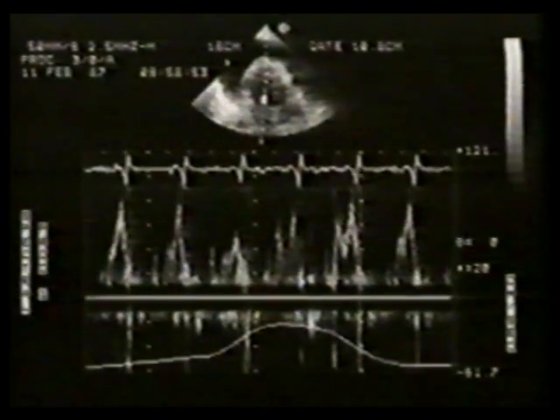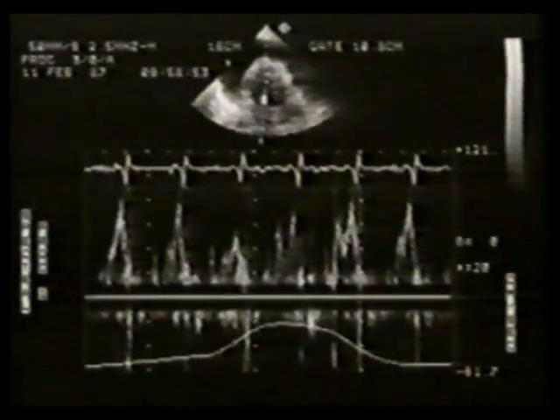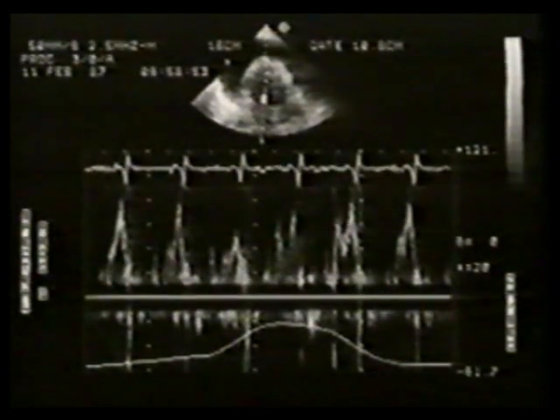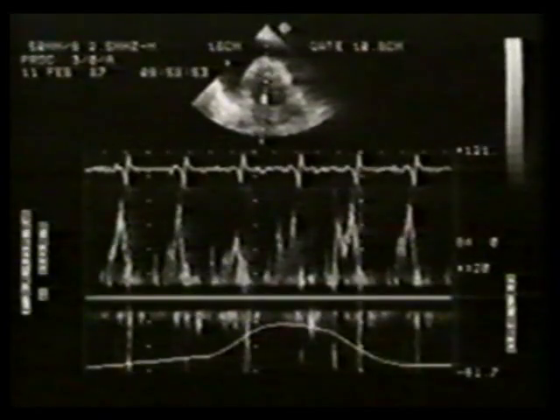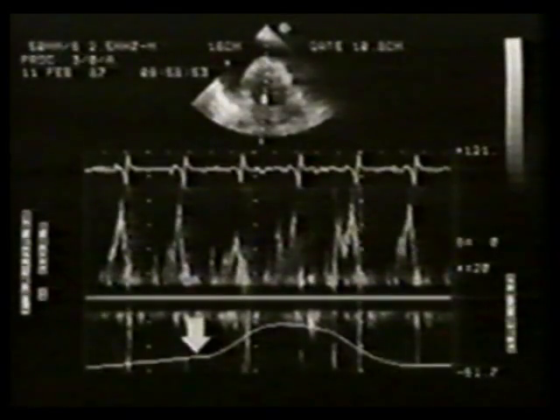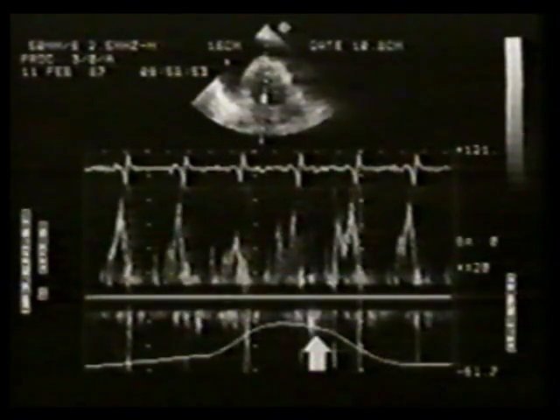There is a small phase delay between the actual onset of inspiration and the deflection on the nasal respirometer. This is in the range of 120 to 200 milliseconds. Hence, the onset of inspiration is here, and the onset of expiration is here.